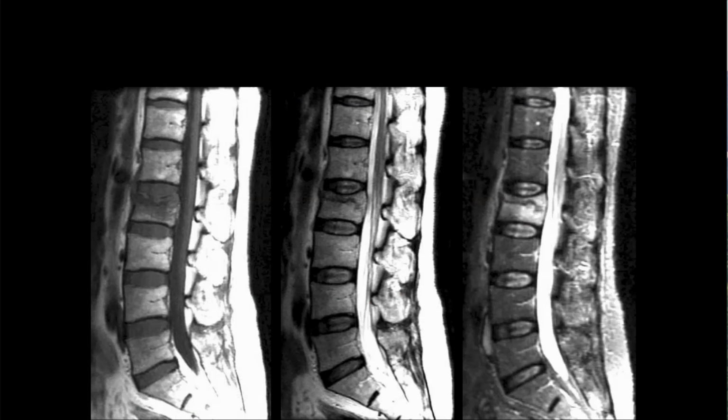Right, so looking at that vertebral body, let's see, 5, 4, 3, L2, we see what looks like a fracture line and surrounding edema. So just a compression fracture. Yeah, it's probably a compression fracture. Now you notice here that the posterior cortex is a little bit abnormal.